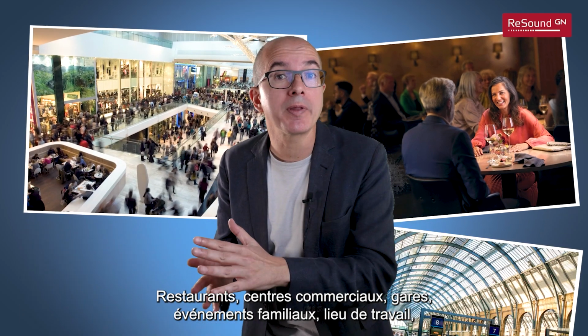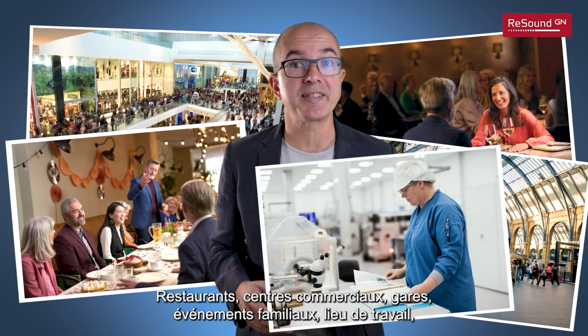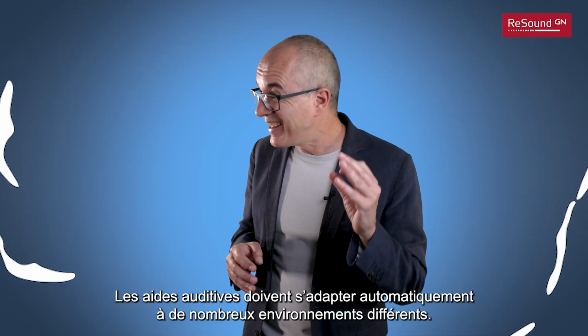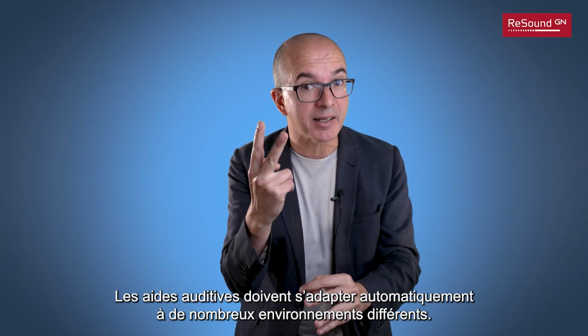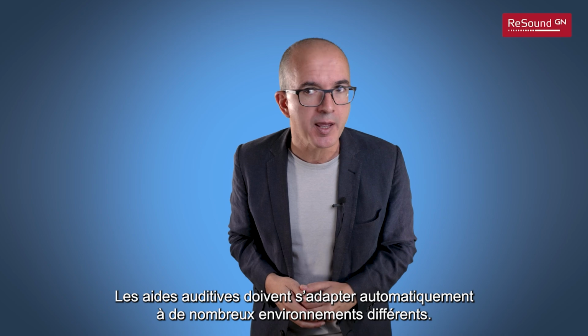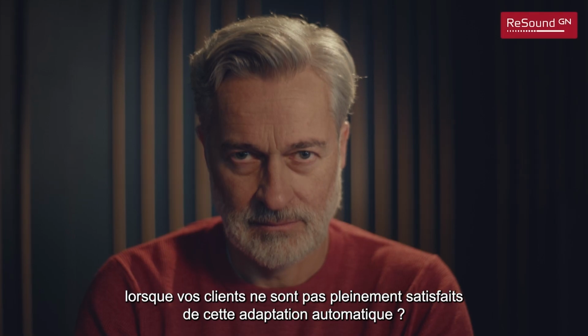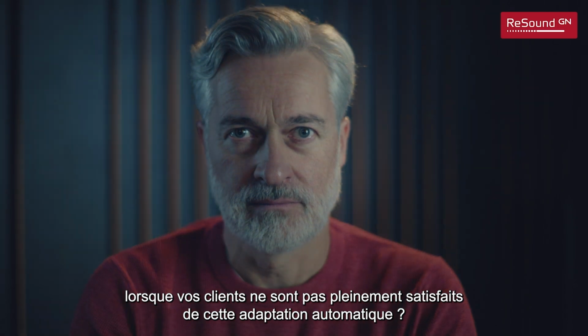Restaurants, shopping centers, train stations, family events, your workplace, a walk in the park, or dinner with your uncle who never shuts up. Hearing aids need to adapt automatically to many different environments. But how accurate are they? And what do you do when your clients are not fully satisfied with that automatic adaptation?